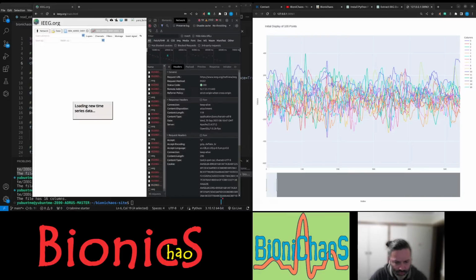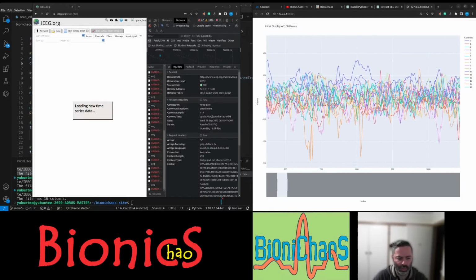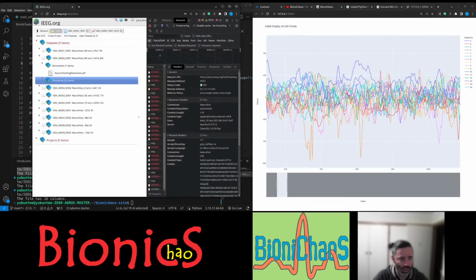Might let it run for a while. Something's still happening. Well, we have the 16 channels.